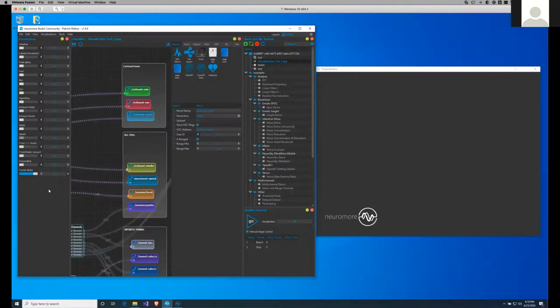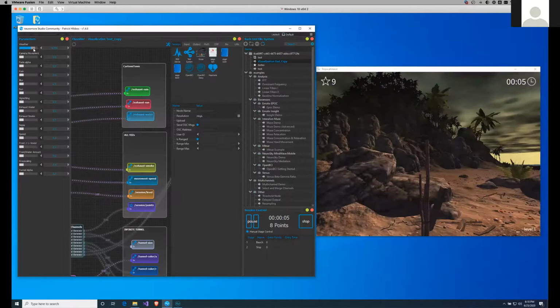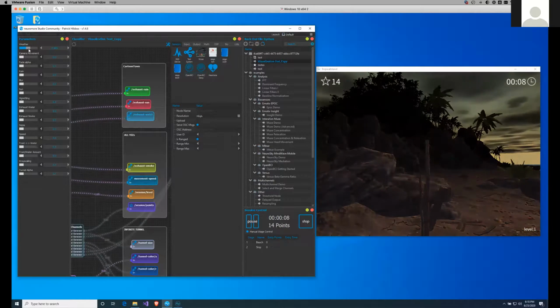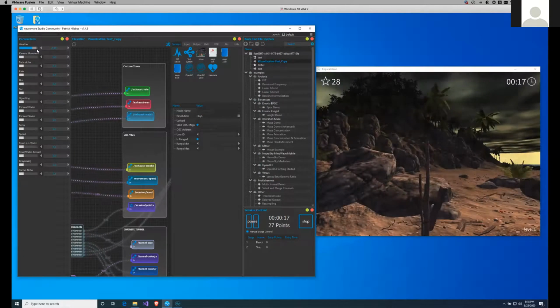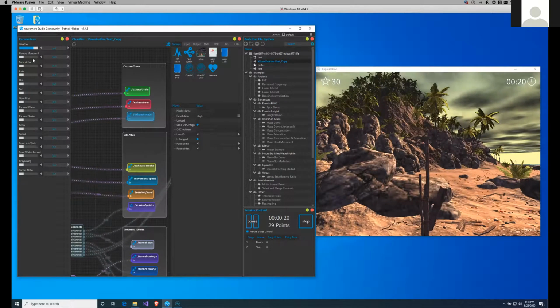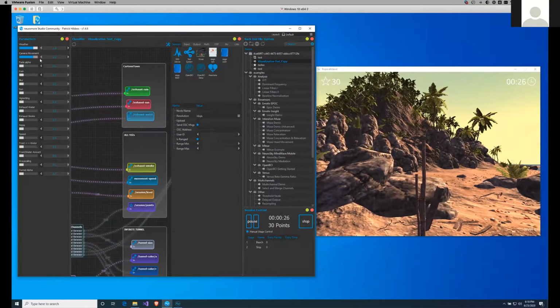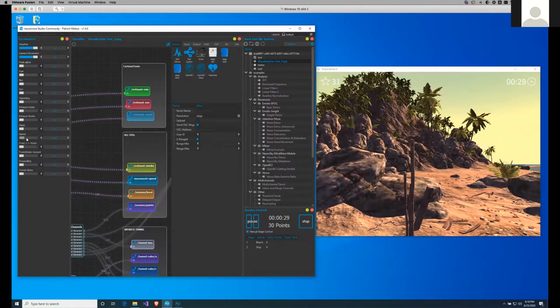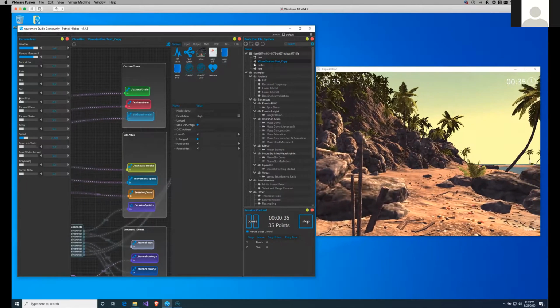So looking at the visualizations that we have, it's a tropical island. And that tropical island also consumes the weather. So same here. If the tropical island is pretty dark, most likely it's because the weather is just close to zero, so it's pretty dark. And another aspect that the tropical island can consume is camera movement. So the camera can just go right to left, and you can speed it up a little bit. So the speed here is attached to the camera movement.